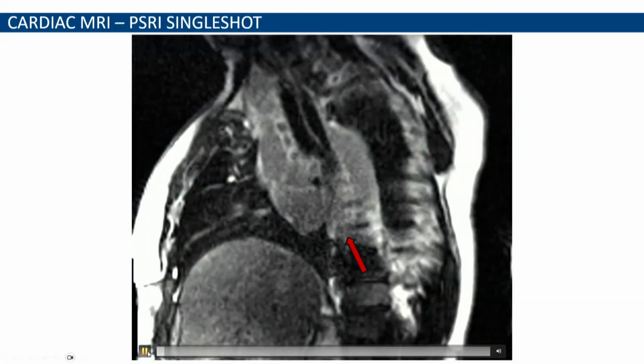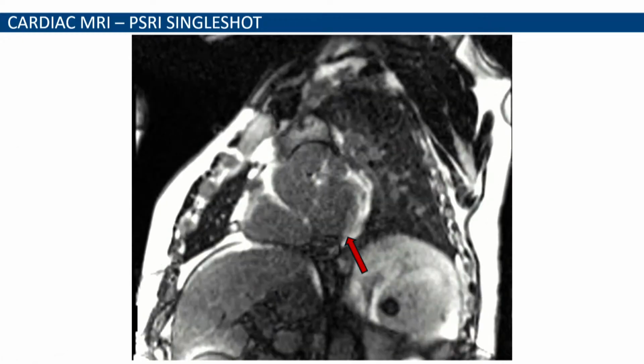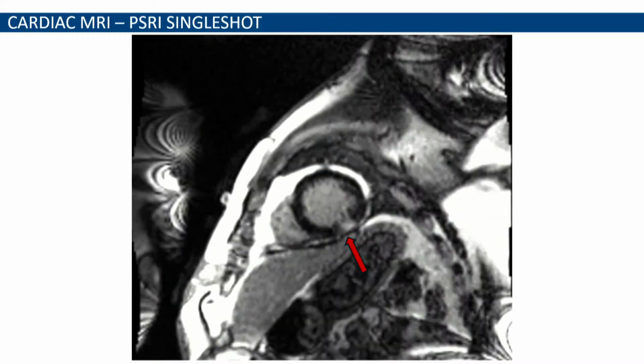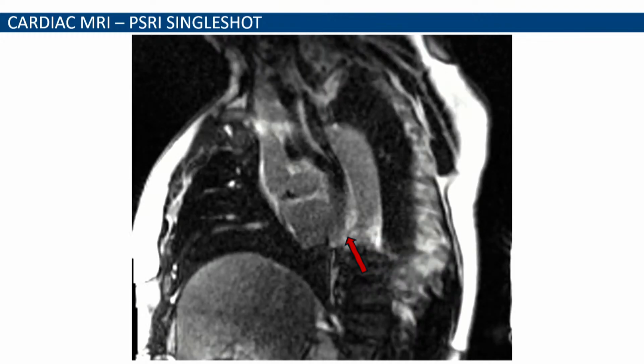This is the inversion recovery, but this is a single shot view, so we can see just the video of the play of the short axis. You can see slowly how, as we go into the apex, we start seeing the scar, and it's also endocardial and transmural, covering most of the muscle thickness.